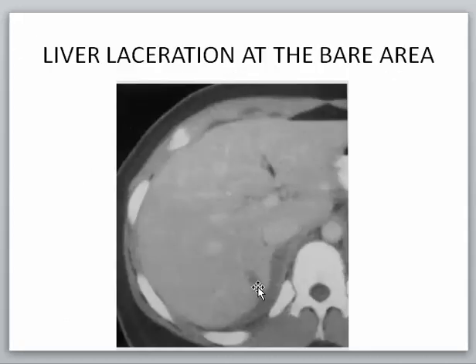Mind you that this type of laceration is a dangerous laceration, because it might not be confined to the liver, but it may involve any of the hepatic veins posteriorly, while going to the inferior vena cava. Thus if you suspect a laceration at this area, at the right lobe medially, with minimal fluid like that, instruct the surgeon that while operating, take care that venous leakage can occur, because once they remove the liver, they displace the liver to work in this area or to discover and see what is there. The blood will gush out and the patient may succumb on the table.